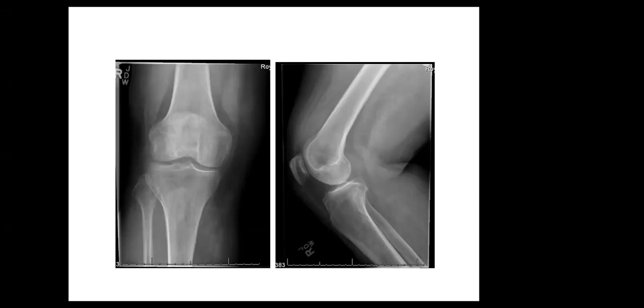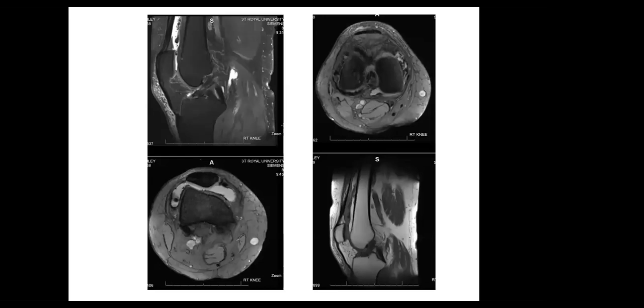Is there an MRI? Are you recommending MRI? If there is MRI for further evaluation. Multisection, multiplanar MRI. There is a joint effusion.